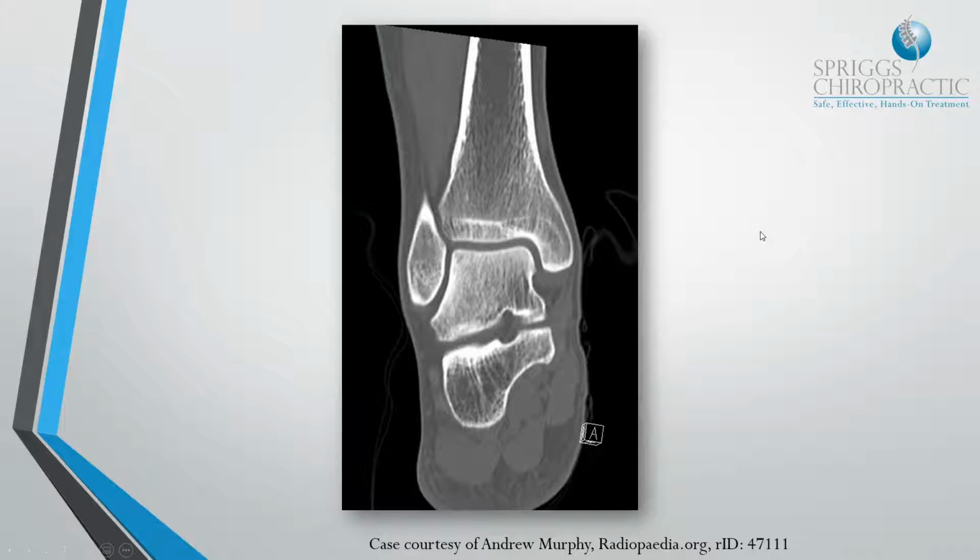But here they are on a CT scan. You can see what I mean, where we have the dome of the talus and lovely joint spaces, medial malleolus just here, lateral malleolus, but what we've only got is the lateral malleolus. We don't have the rest of the fibula, whereas here we've got a nice shot through the mid aspect of the tibia. So the fibula and tibia are not going to be directly aligned with each other, so when you're taking some of these advanced images, some of the anatomy will be missed.